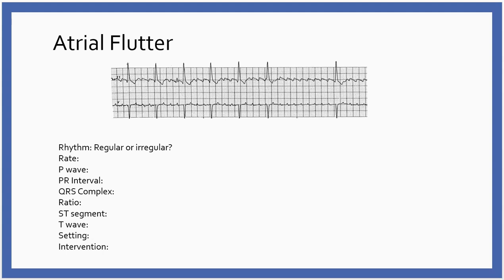It's actually causing some atrial contraction, but the atrial contraction is so fast, on this strip about 270 times a minute, that we really don't move a lot of atrial volume. And remember that the atria can tolerate contractions at 270 a minute, but not the ventricle. We would have no ventricular filling time and pretty quickly a dead patient. So what does our heart do? The AV node protects us from excessively high atrial rates, and so only some of that conduction, or that electrical activity from the atria, gets through.